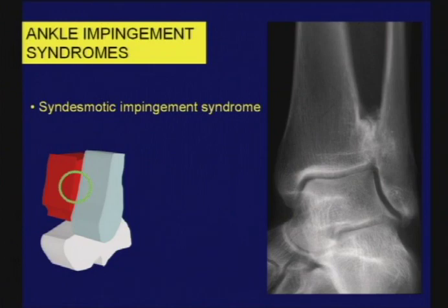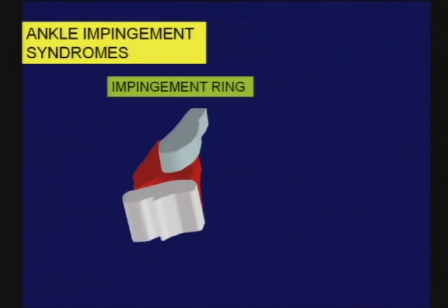And then the final pattern of impingement, which has been emphasized in a few cases, relates to the syndesmotic segment of the joint. This can represent scar tissue or synovial proliferation extending up into the synovial recess there. It can also be osseous in nature. Following an injury, one can see cases like this where there is extensive bone proliferation and a pseudo-articulation between the tibia and fibula. So trying to put all this together, I would say the following.